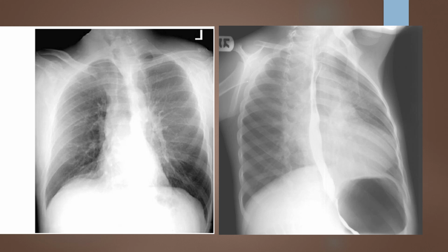Here I can count my ribs. I've got rib 1, 2, 3, and 4. That means this is my fourth vertebra right here, and then I can see my manubrium very close at the level of that fourth vertebra. So my mid-coronal plane is not terrible. However, if I come over here and I look at my apice to clavicular distance, that's going to be less than 1, so that would indicate that my patient is tilted posteriorly slightly, elevating that clavicle towards the apices. So when I correct my patient rotation, I am also going to correct their mid-coronal plane tilting.